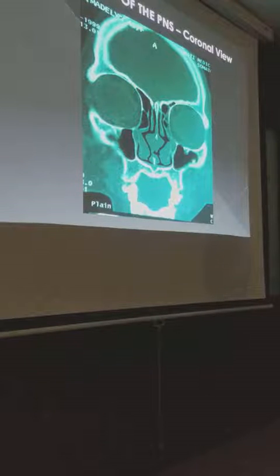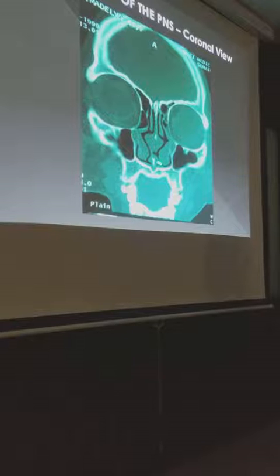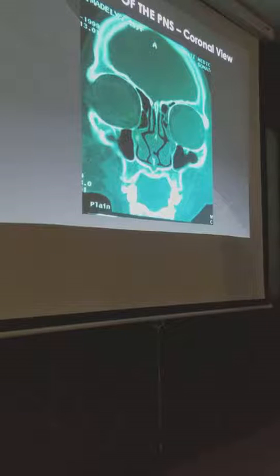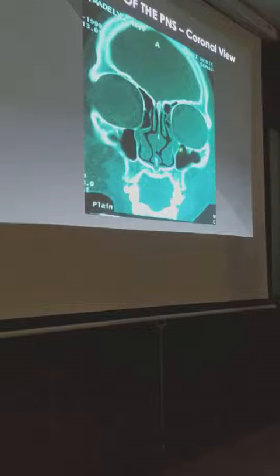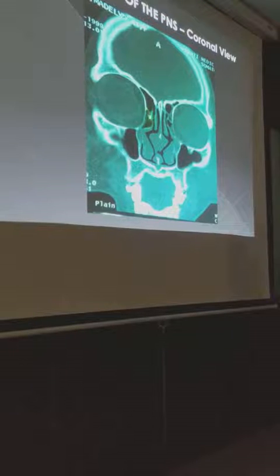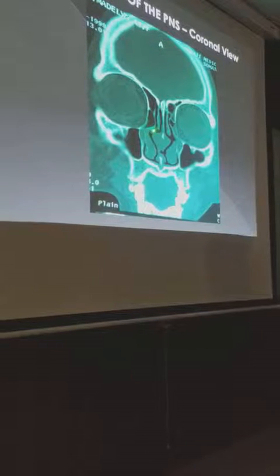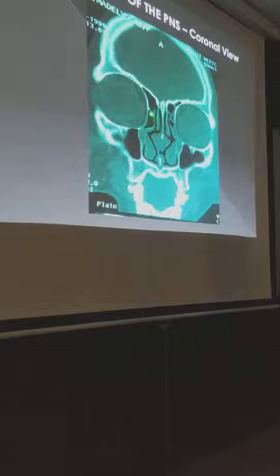Here, okay. So again, orbit, brain, septal tubercle, inferior turbinate. What is that cell? Meron ka pa bang nasolacrimal? Look at that. Yes, diba? You see this? Okay, so that is still your agger nasi. And then you see here, what is that? Malaking agger nasi nitong patient na to. So you can see here that the inferomedial aspect would be the part of the uncinate.